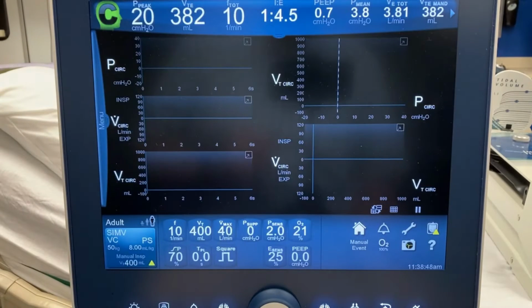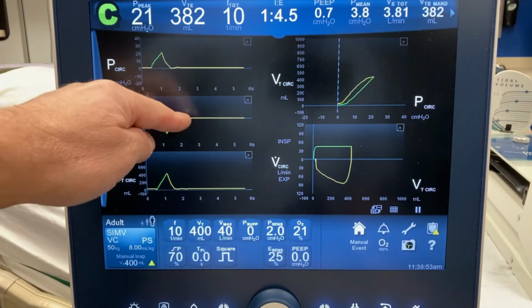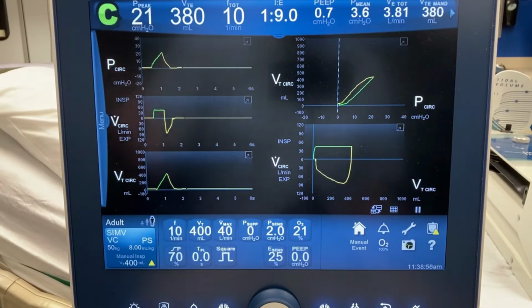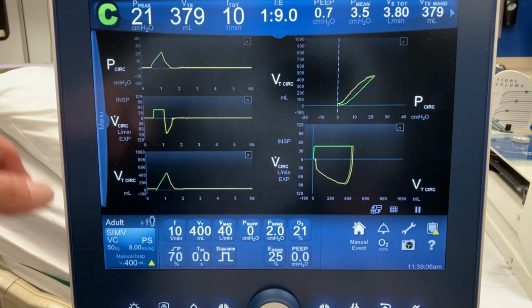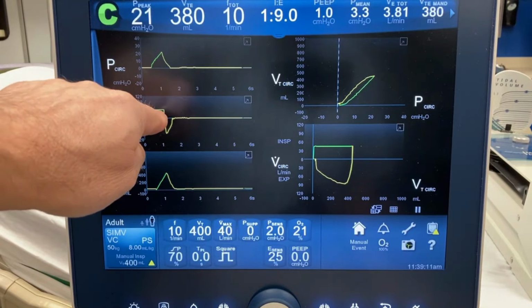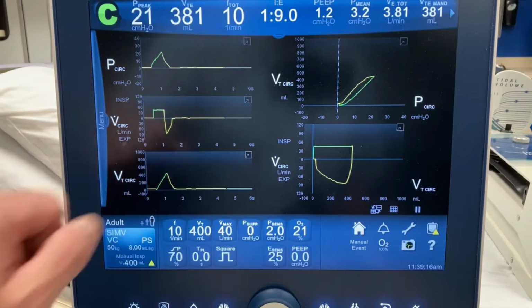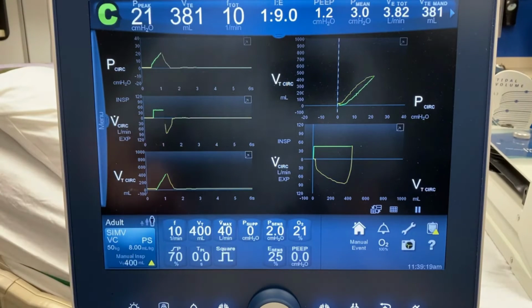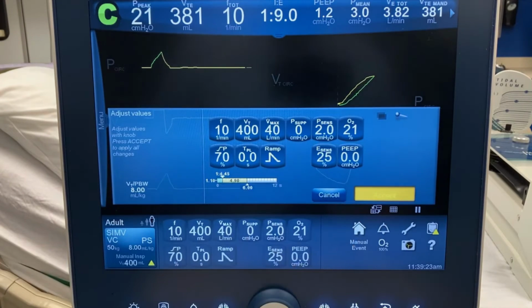See, we're going to get some higher pressures. This delivers the same flow the whole time, and it changes the shape of our pressure waveform too. Now, actually, I have this hooked into something with almost no resistance, so the pressure didn't change a lot, but it's negligible right here. But if we had some airway resistance like in a real lung, you would see that once this higher flow hits the smaller airways, it's delivering the higher flow at the end of the breath. It gets down to the small airways, it's going to generate more pressure. We'll go ahead and switch that back to the decelerating waveform.